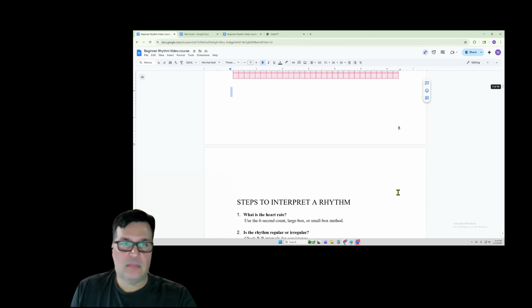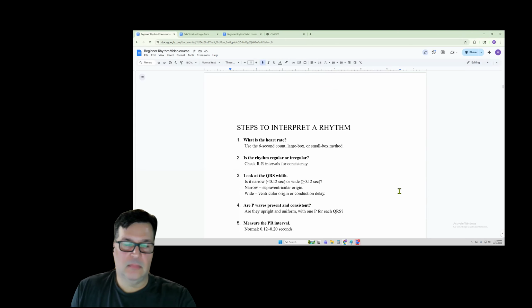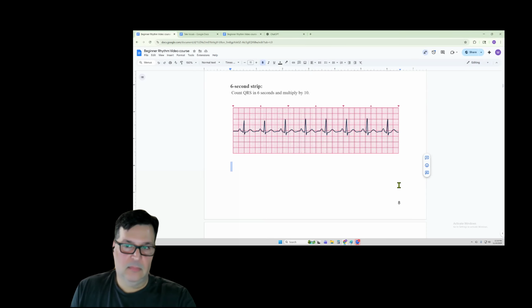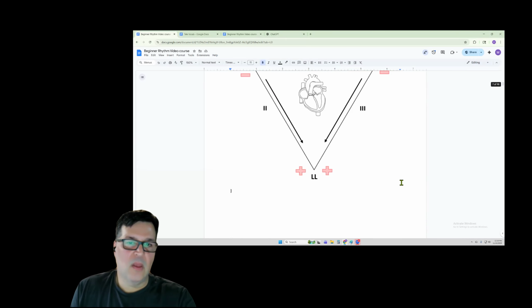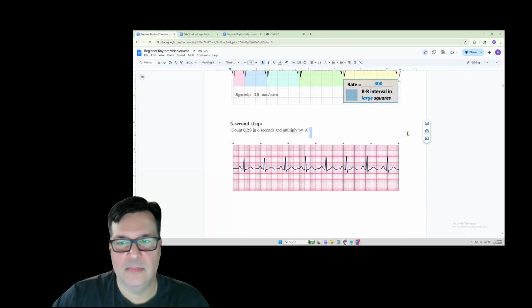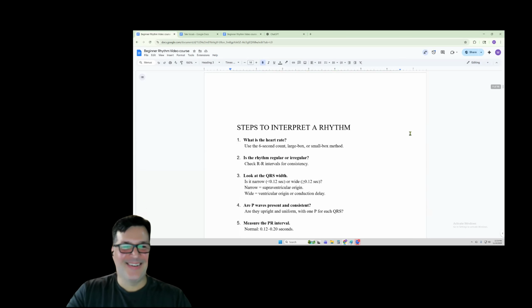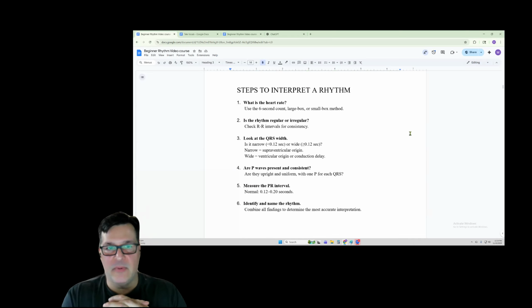And I think I was a little bit worried it had to be exact with the boxes when it's not exactly from a bold line to a bold line, but it sounds like you can kind of see where it would lay roughly. Yeah, like if the line is consistently, I would say 300, 150, 100, 75, you just kind of visualize shifting that over. So this would shift over there. I see what you mean. Shifting it to that bold line. Yep.